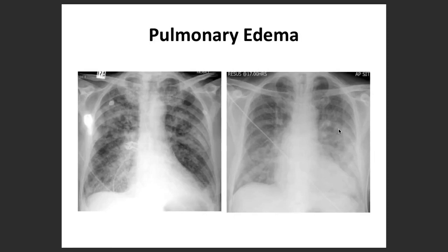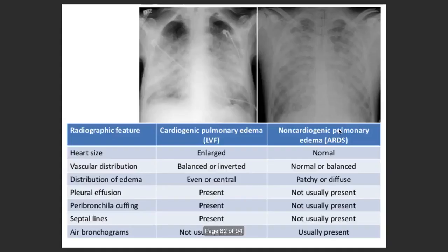Pulmonary edema. You all are now the master, I would say. You will not be able to forget, right? I've already shown you so many examples now. One of the important things which I really wanted to highlight was about cardiogenic pulmonary edema or non-cardiogenic pulmonary edema, ARDS, that is what it is called. So it is very important to diagnose that.